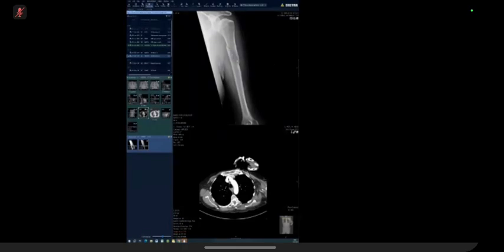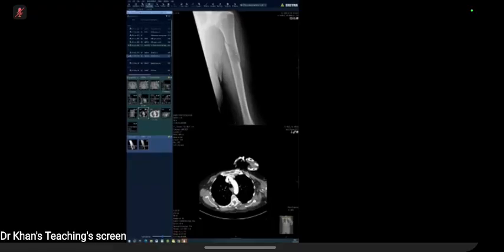So describe the fracture. Always say displaced or not displaced, stable or unstable, if that applies. It doesn't really apply here much, but you can say that there are cortical breaches on both sides. And you rightfully said there is a lytic lesion. Straight away you said the bone is normal, and then you said it's abnormal. Like I said, always with the fracture in a VIVA, there's something wrong about the fracture. It's not a simple fracture.